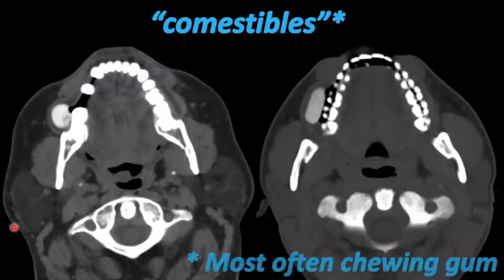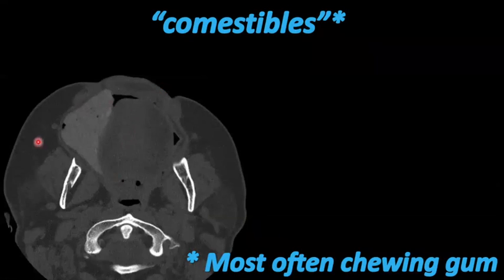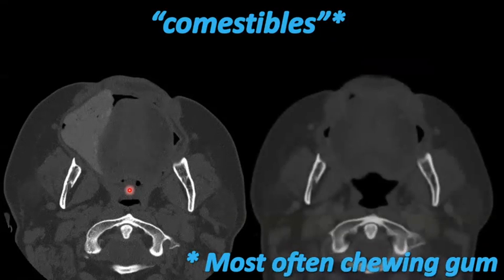Sometimes you're lucky because somebody happens to leave something behind when they get in the scanner, a bit of candy or a bit of chewing gum, and you can start to see the buccinator muscle being pushed away, kind of blowing out the cheek, and people remember, oh yeah, when someone has their mouth closed, there are actually two opposed mucosal surfaces here. And sometimes you're super lucky and your head and neck patient comes in with a wad of chewing tobacco in their cheek, which they can then kindly take out so that you continue your imaging.